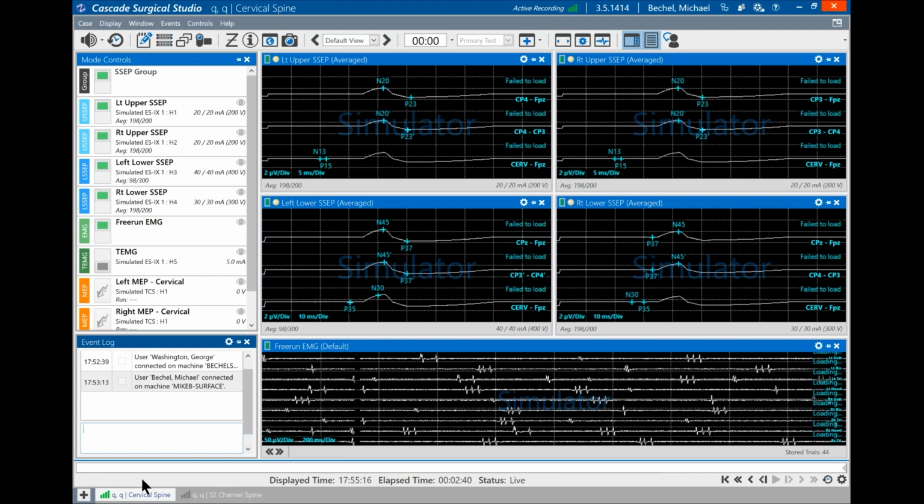There's advanced data management that will automatically synchronize offline data. So you don't have to be on the CadLink when you're recording. So if you weren't able to connect for some reason, it doesn't stop you in any way from recording your information. You gather the data. The next time you are plugged in and synchronize, it will automatically do that for you. Nothing to worry about there.